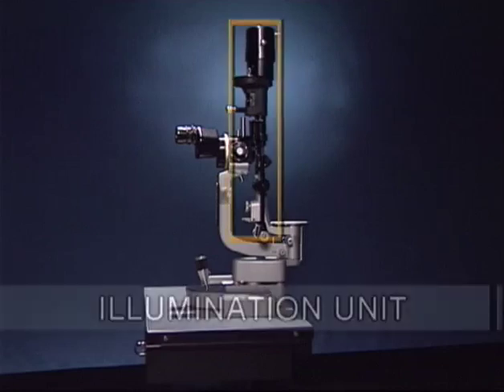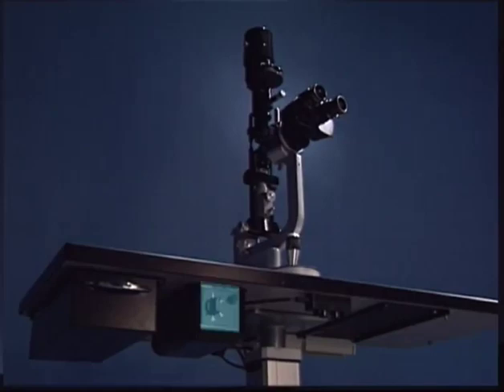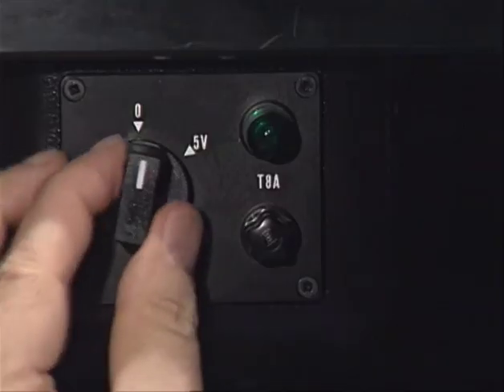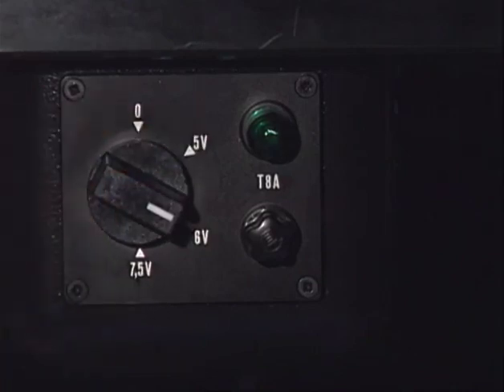This is the illumination unit, which contains all the devices for shaping the light beam. The light is turned on at this rotary switch. By turning the switch clockwise, the brightness can be increased through hypervolting the light bulb.